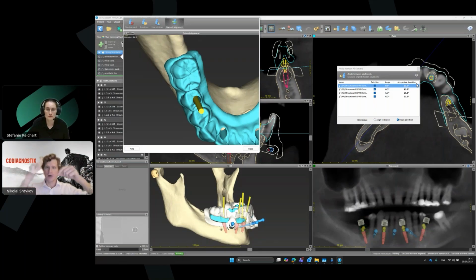So you put one coping inside, then you put the prosthetics with the cage, then you fix it gently, then you unscrew, remove the prosthetics, put another one in the prosthetics, screw again, and when you do this one by one, it takes more time, but the benefit is that you will have small holes. If you don't want that, you can do this more easily, just with the big holes and drop it.